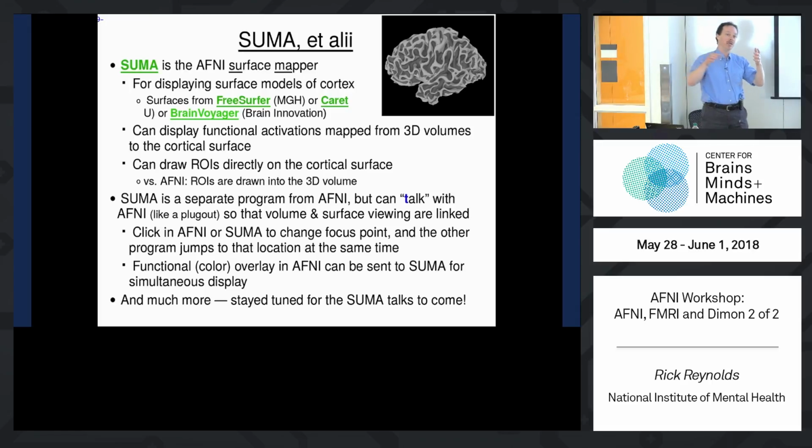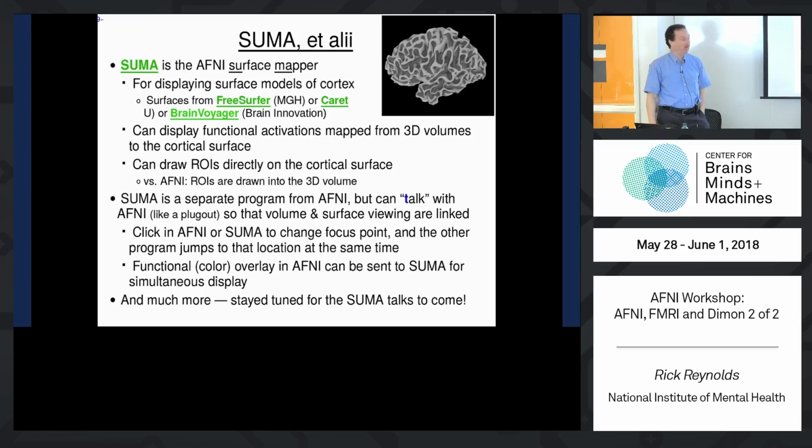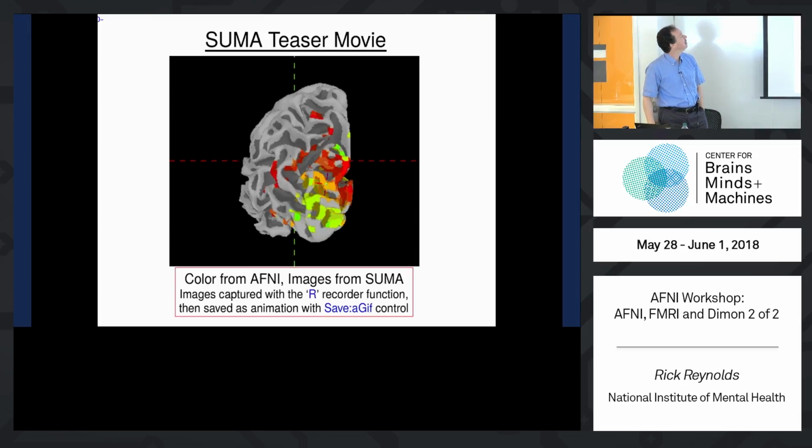You can look at correlation matrices, a sparse matrix of nodes in a data set that have correlations or some DTI measurement weights between them. You can show these in space, even connected to the surface and locations and rotated and all that. You can do wild stuff. Hopefully Daniel will have time to show you some of that at the end.